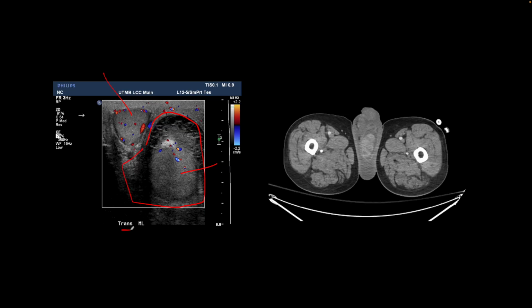And so this is a transaxial image in midline from the ultrasound, and this is a corresponding image from the CT of the abdomen and pelvis showing hyperemic and enlarged testicle on the left side and the hydrocele. So this CT shows the classic appearance of epididymoorchitis seen on the CT scan, and with a good correlation with the ultrasound.